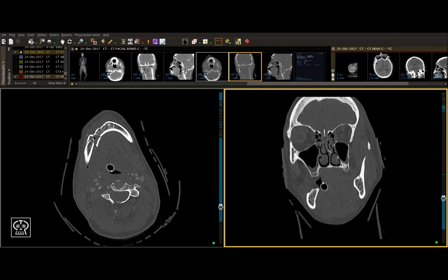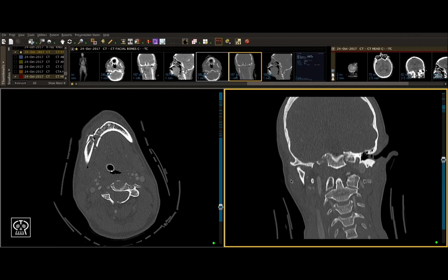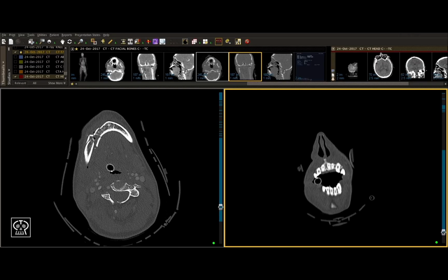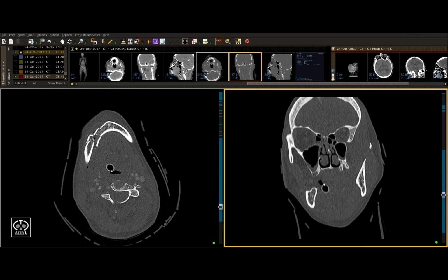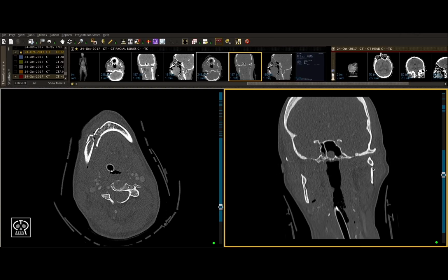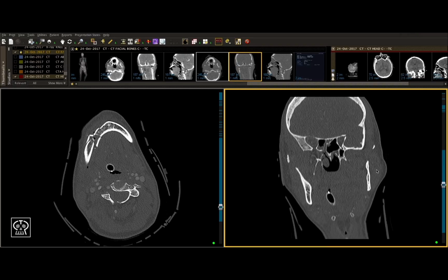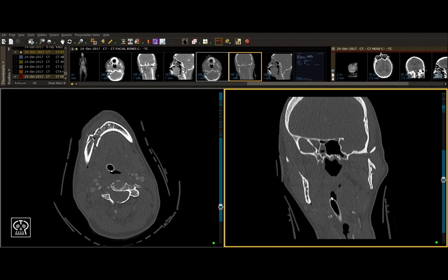As we scroll back on the right side, we're double checking to make sure we don't see any more fractures in the mandible, including the ramus, coronoid, and condyle. The right side seems clear otherwise. Starting from the front now, and examining the left side, we do see a fracture here that correlates well with what we saw in our axial scan. You can see the condyle here in the fossa. However, at the base of the condylar neck, there's a fracture, and the condylar neck has been displaced laterally.